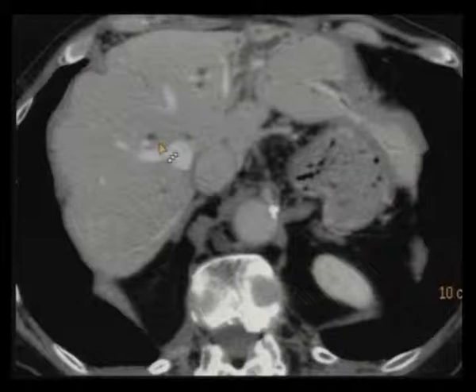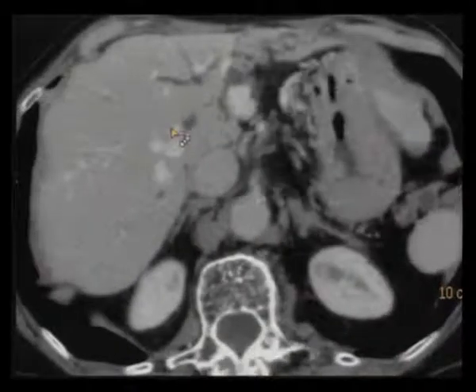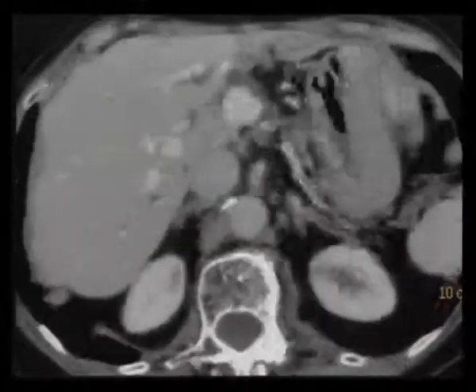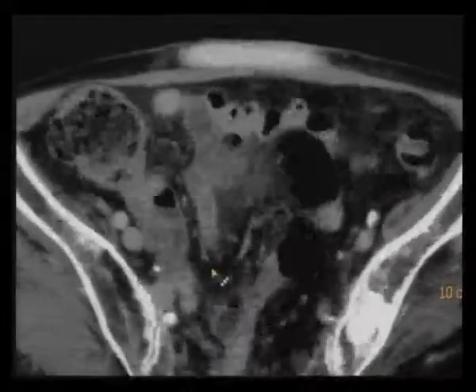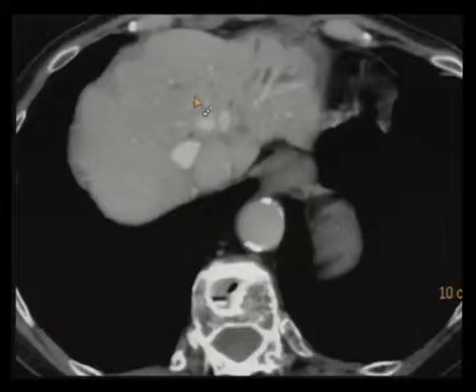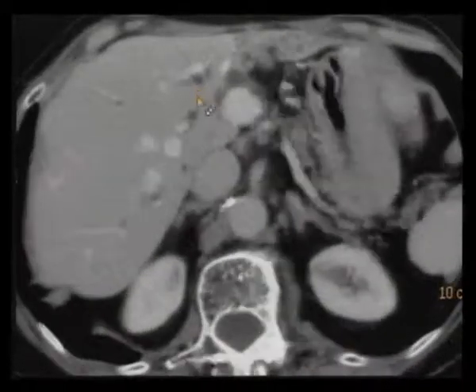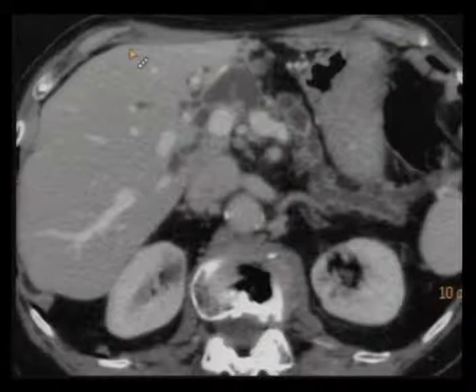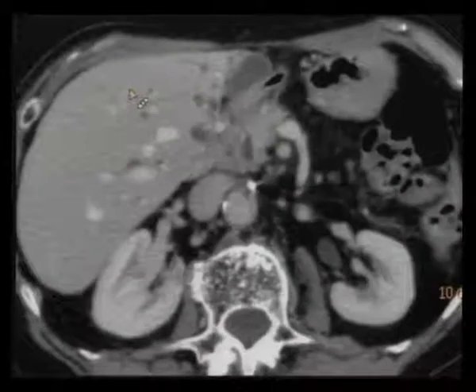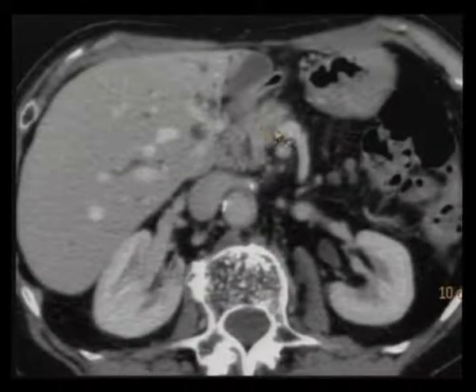Personally, looking for a pancreatic carcinoma, I start with an overview in a portal phase to see if there are liver metastases, distant metastases, looking for free effusion, perihepatic, perisplenic, or deep in pelvis that are the first sign of carcinosis. Then, following the enlargement of the biliary tract and the enlargement of Wirsung, we finally land on our tumor. It's very easy to reach the tumor. This is the tumor. It's close to the superior mesenteric vein.